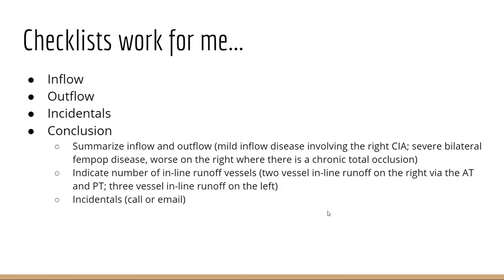And then conclusion, I'll summarize the inflow and outflow vessels as well as describe the runoff, the number of runoff vessels bilaterally, and any pertinent incidentals. And by pertinent incidentals, I mean things basically like acute fractures or cancer are the ones that I commonly see, and I'll end up calling or emailing the physician because oftentimes they'll get lost in the body of the report.